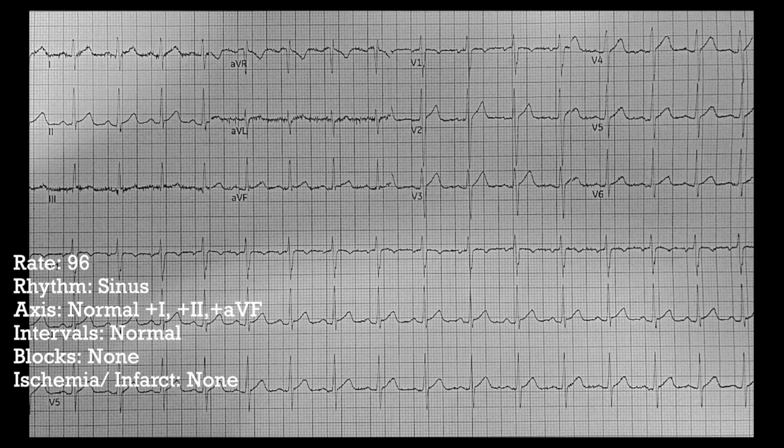Finally, we look at pattern recognition. Any funky patterns that we see in this one, like big peaked T waves that you might see with hyperkalemia, or hyperacute T waves where the T wave is like 3 times the size of the QRS complex or something like that. Again, we'll get into the different patterns later on as we find them. But in this case, everything looks pretty much normal, and I don't see any of the obvious patterns that I would be looking for.